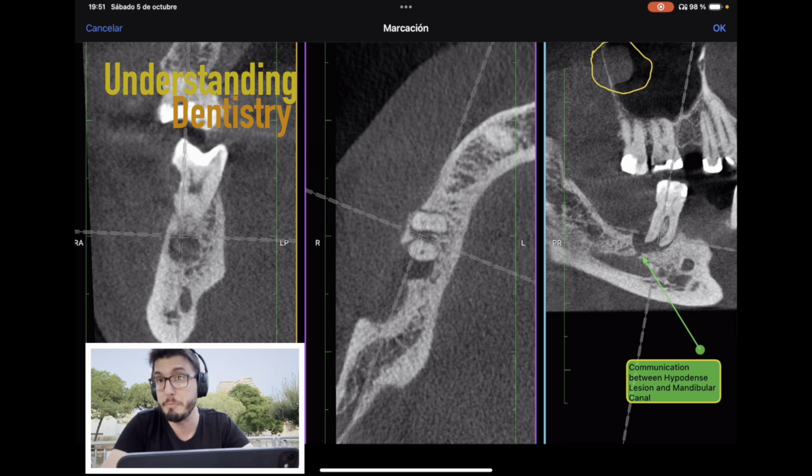That's a sinus polyp. The diagnosis is purely, or more than enough to be, radiographic, and that's your diagnosis. Well, very good. Let's analyze a little bit this upper arch as well.